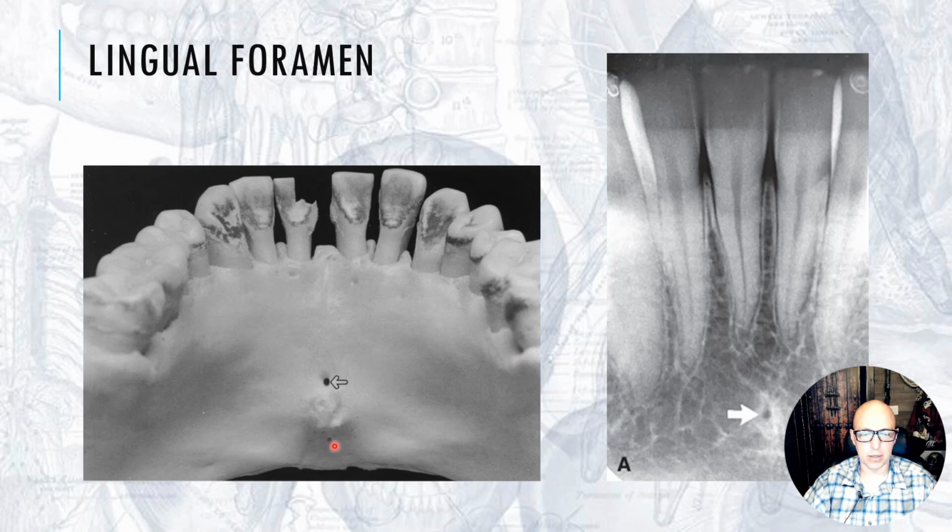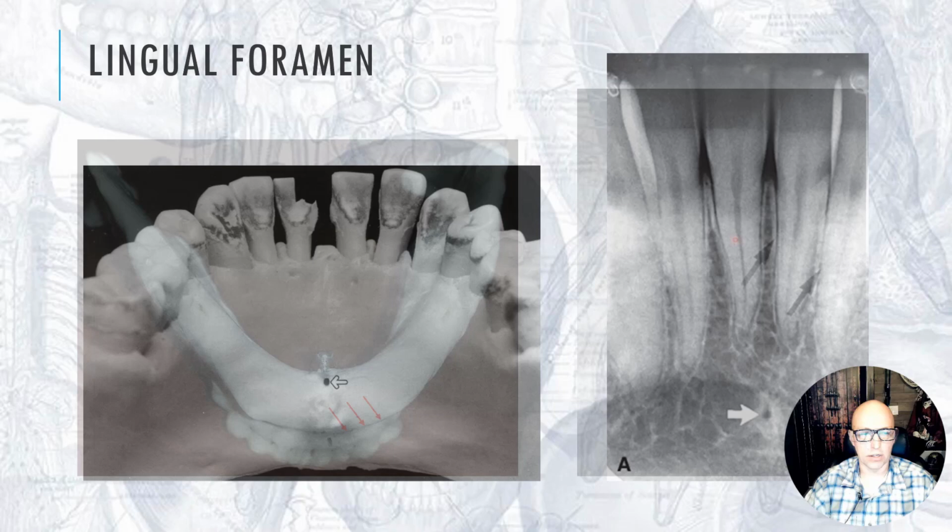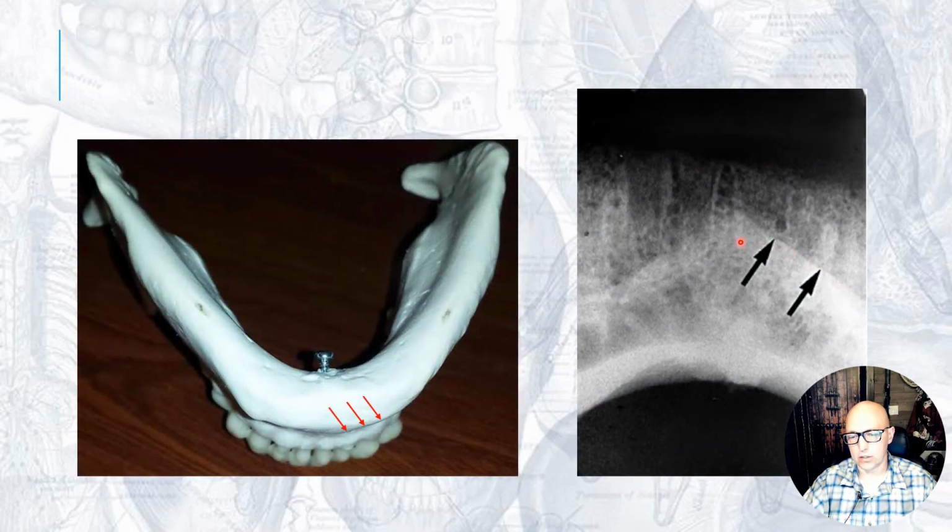You can see a little foramen here. Sometimes a lot of accessory foramen, so a lot of variation to that. All right, you see this. Does it look like a bony structure or soft tissue structure? It's kind of hard to see the cortex. The inferior mandible, remember the cortex is really thick. So actually several millimeters here is probably the thickness of the cortex. That's why we're not getting that nice thin eggshell type effect, but you still see it because you see the thickened cortex here. Compare it with on the lingual here, very thick cortex.